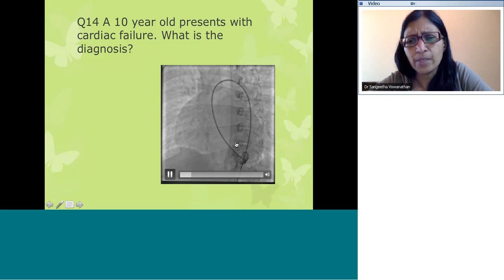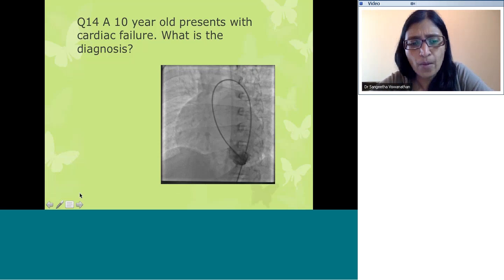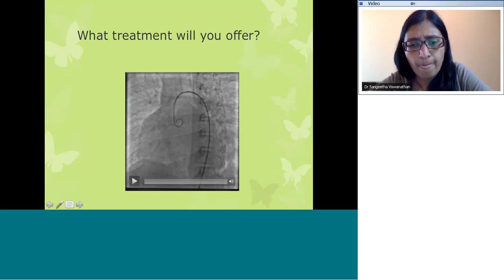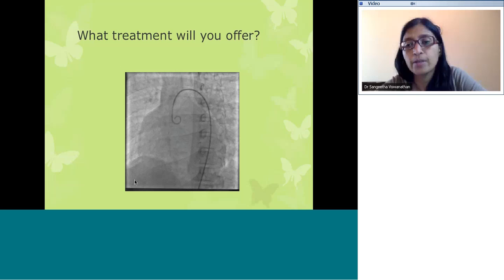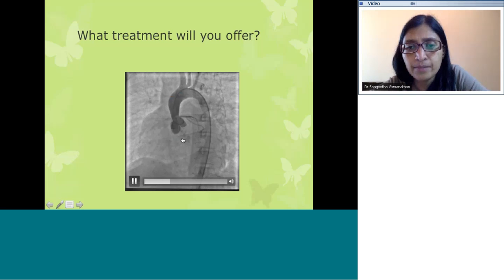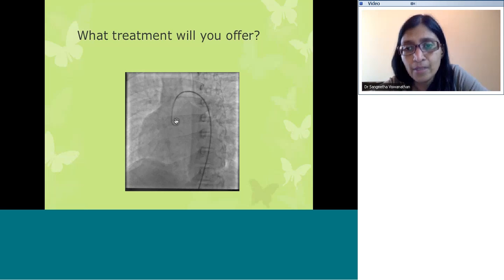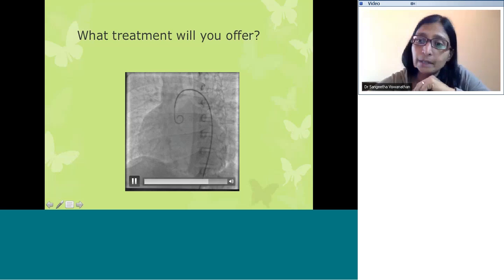Not LV non-compaction. What do you see here? Right. So this may help you a little bit more. So now are you convinced? This child has got significant severe supravalvular aortic stenosis and had depressed cardiac function.